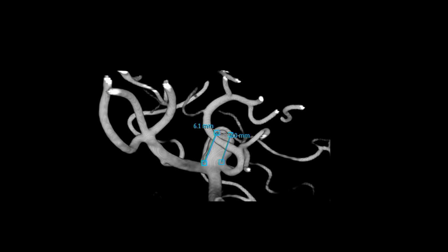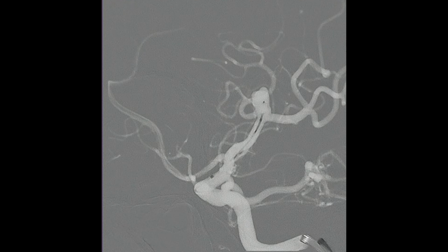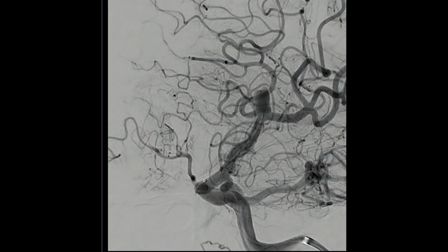For example, although many reports advocate the +2-2 sizing strategy in larger aneurysms, we do not routinely follow this practice. This is because we select the device based on the aneurysm's maximum dimensions, regardless of its morphology, which often means the selected device is already on the verge of oversizing by conventional standards. This allows us to reach the same results without significant width adjustment.